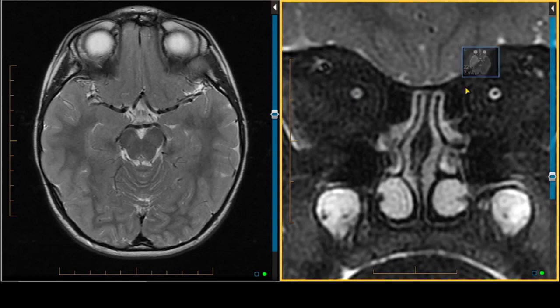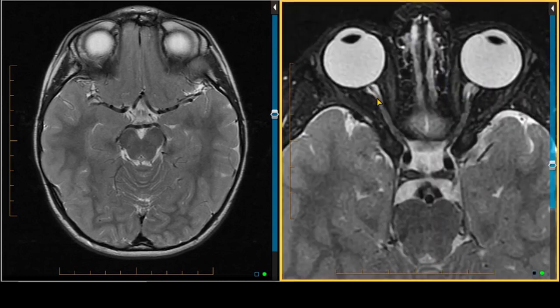And the axial image confirms you just see a very thin optic nerve, which is the T2 hypointense structure within the central aspect of the optic nerve sheath. If you remember, the optic nerve is, truly speaking, a part of the central nervous system. It's surrounded by CSF and dura. The dura is the optic nerve sheath. So this patient has bilateral optic nerve hypoplasia, also hypoplasia of the optic chiasm, and absence of the septum pellucidum. That spectrum of abnormalities is known as septo-optic dysplasia.